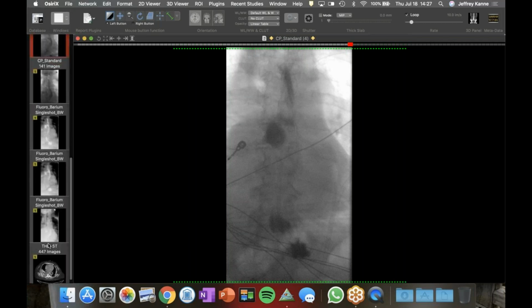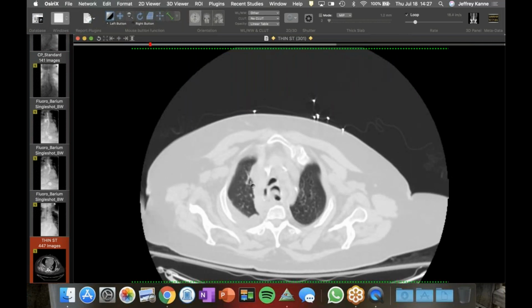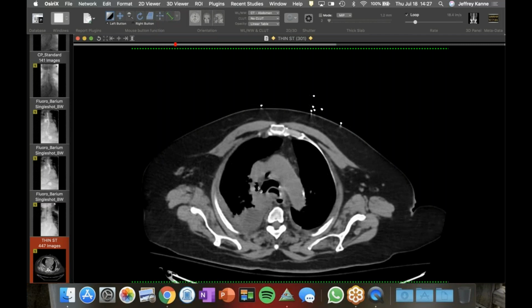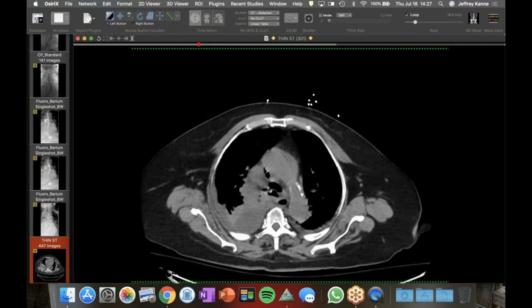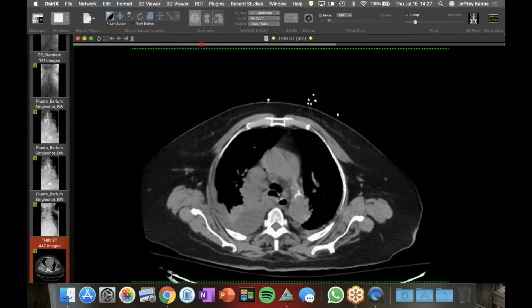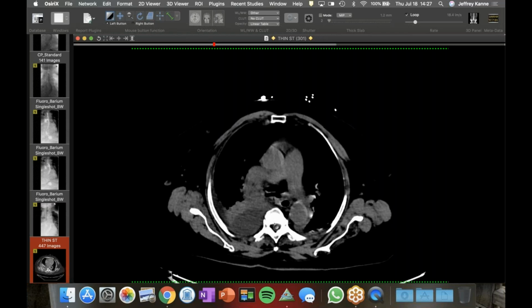And then we did a subsequent CT, which I believe was this one here. Yeah, there you can see. So on this one, you can see there's some contrast pooling up in there, but this is the space that was created during the mediastinoscopy. They took out all these lymph node packets when they were in there, and then it just sort of dissected along there. And then the other thing is you'll notice this pleural effusion is sort of becoming convex that way.